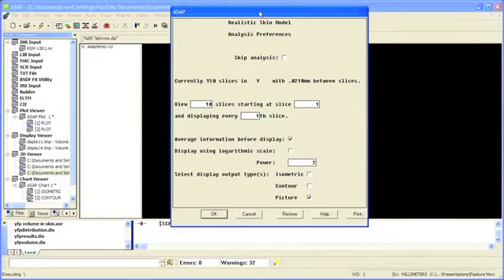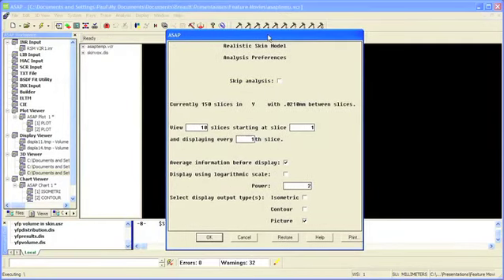Now we're presented with the ability to perform analysis via a dialog system. The RSM calculates, based on the number of slices and the size of our analysis region, the spacing between the slices, which will allow us to more accurately select which slices are of importance to us.